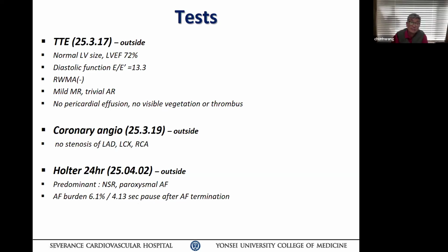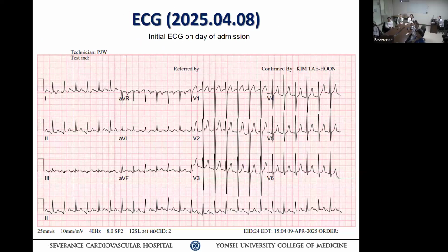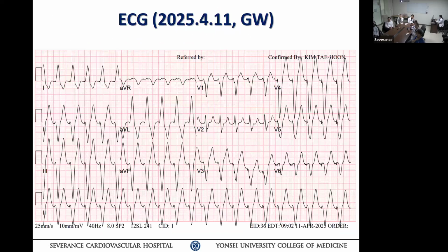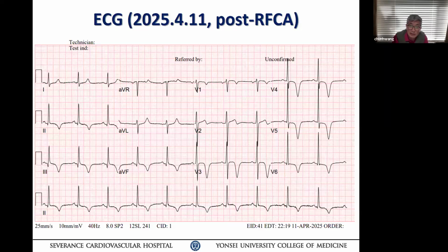Okay. So this was her initial electrocardiogram on the day of admission. Okay. What do you see? That's right. Then after the first EKG, this was taken in the morning, and this was after the ablation on the same day. Oh. Wow. So they did ablation same day. Yes.